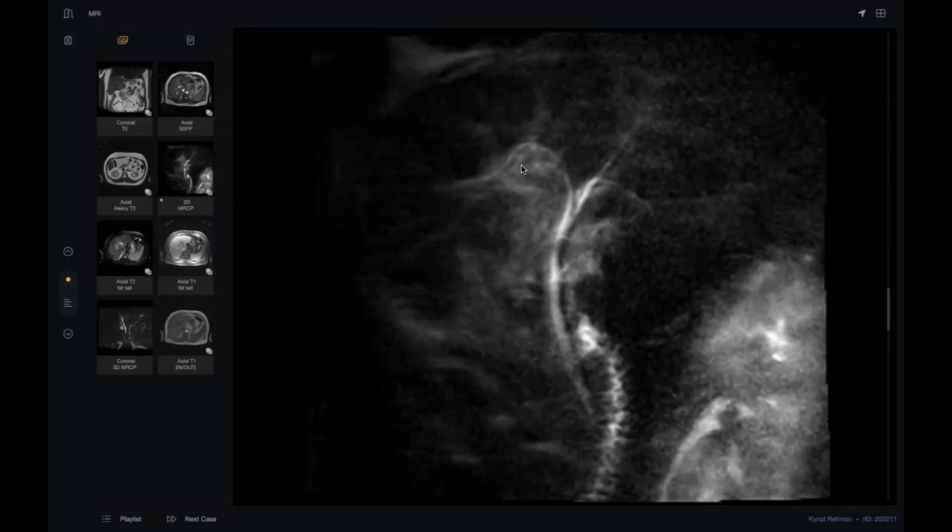No. See, but the most common cholangiocarcinoma takes enhancement or contrast in arterial phase, yes or no? No, on delayed phase. So cholangiocarcinoma will show delayed phase enhancement. A delayed enhancement. This is the buzzword and the most common term related to enhancement of cholangiocarcinoma. Okay? Delayed enhancement. Why? What is the underlying pathology? Why does cholangiocarcinoma take contrast in the delayed phase?